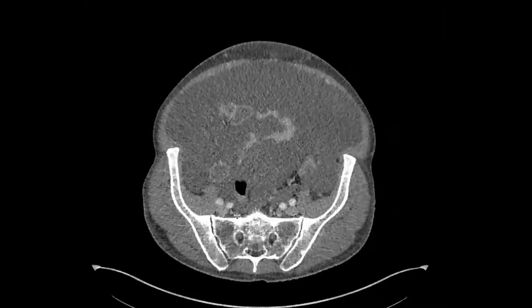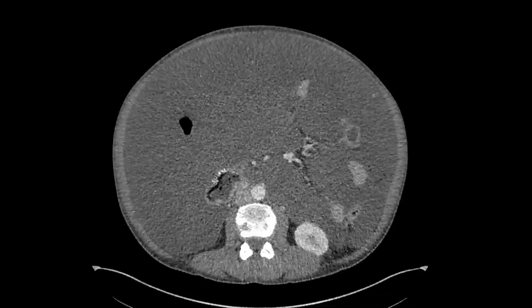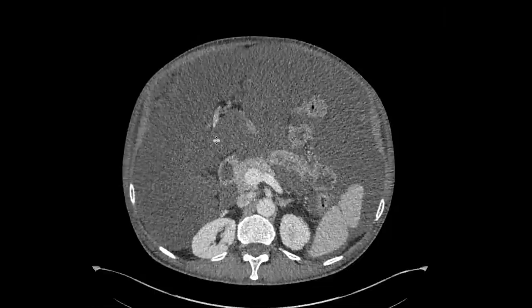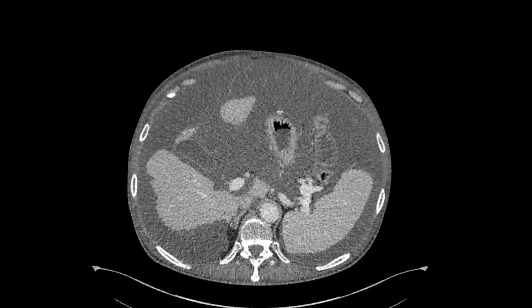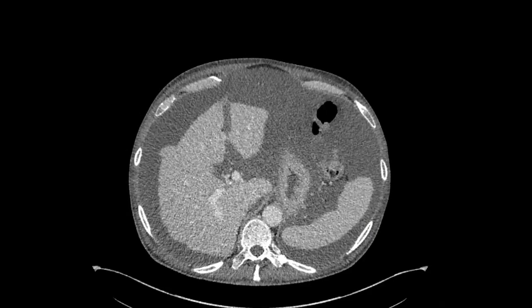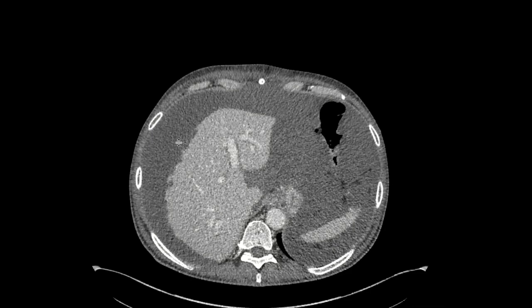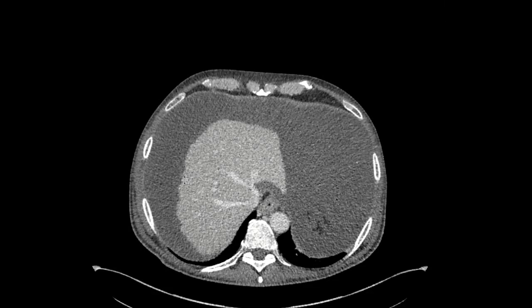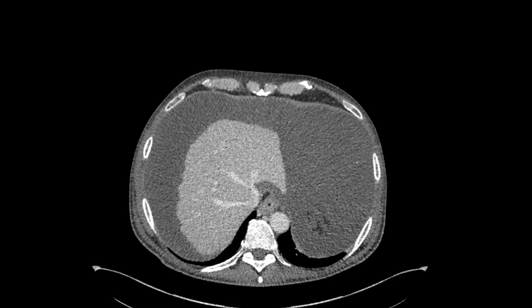deposits. Here you can see the partial colectomy that was done. I think it was a right hemicolectomy that was done with this patient with a ruptured appendiceal mucocele. And one of the features of this, which is called pseudomyxoma peritonei, is that the fluid that's generated is sticky, is mucinous. It's not like your regular ascites. And so this fluid can actually have mass effect on the liver.